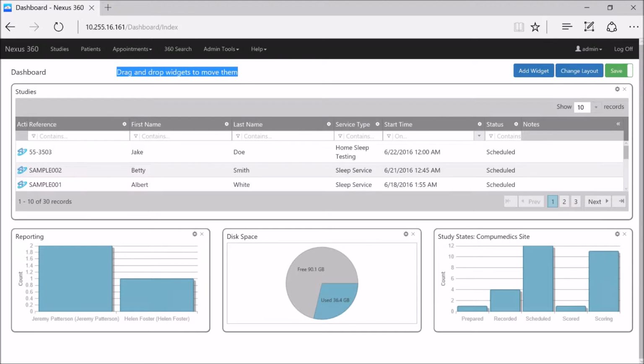In edit mode, some of those pre-configured widgets that I already have in there, all of them now have settings or cog icon in the top right hand corner, and this will allow you to adjust the settings dependent on the widgets that you've actually chosen.